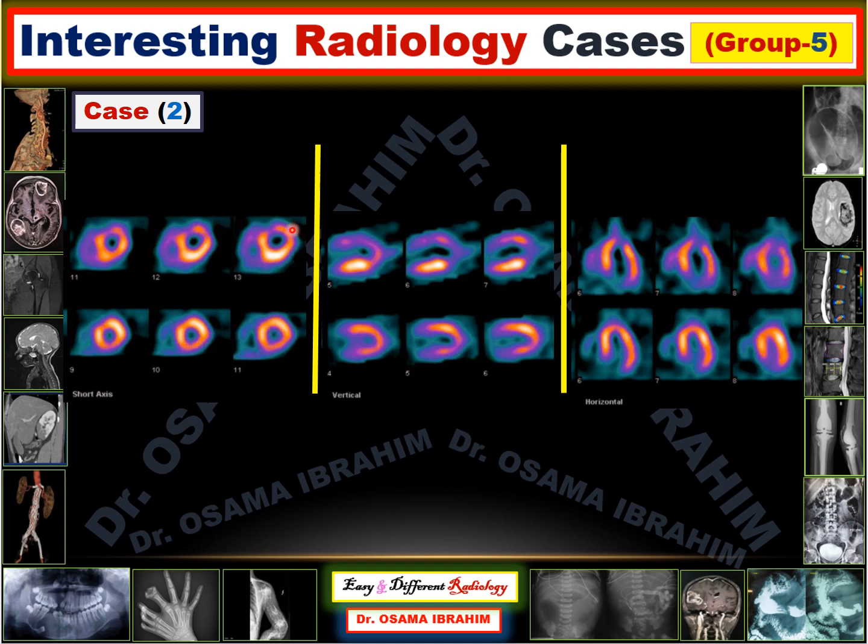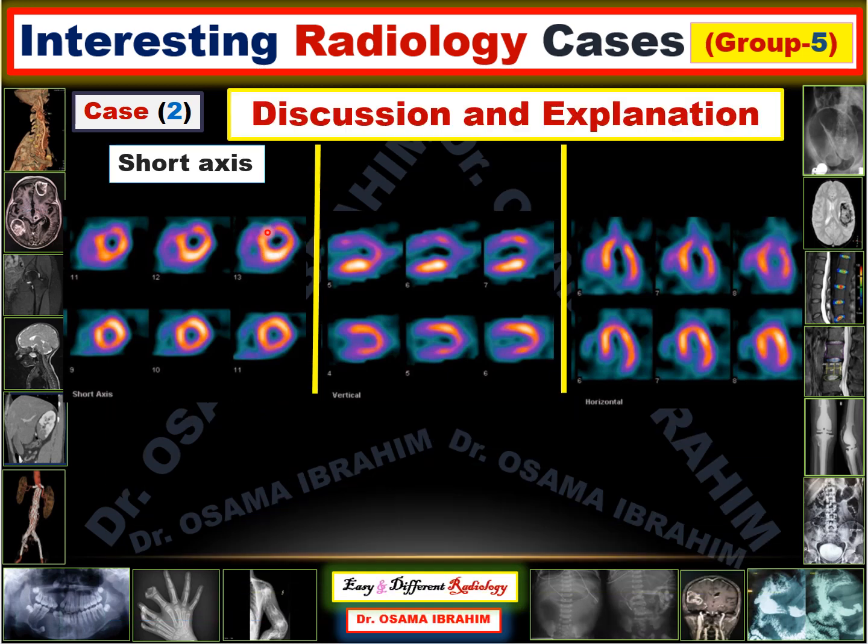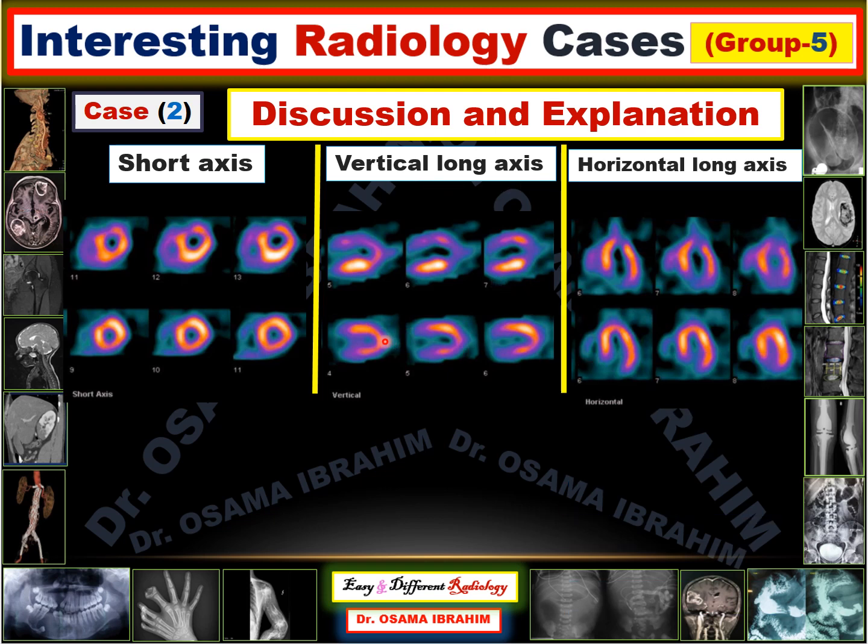If you look at the 4 walls and you can find them like this, it is called the short axis view of the myocardium. However, when you find the myocardium in only 2 views, the anterior wall and inferior wall, this is called the vertical long axis. And also this is the apex in the vertical long axis.